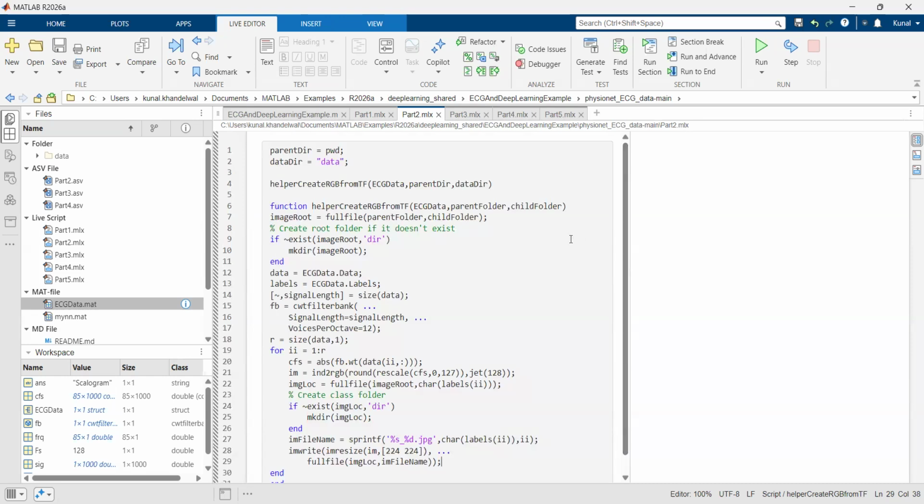With this one script, we can take raw heart data, convert it to a time frequency scaleogram, resize them, and drop them into label folders for a neural network. Let's automate. And before I go ahead, I'd like to show you, I did this previously.